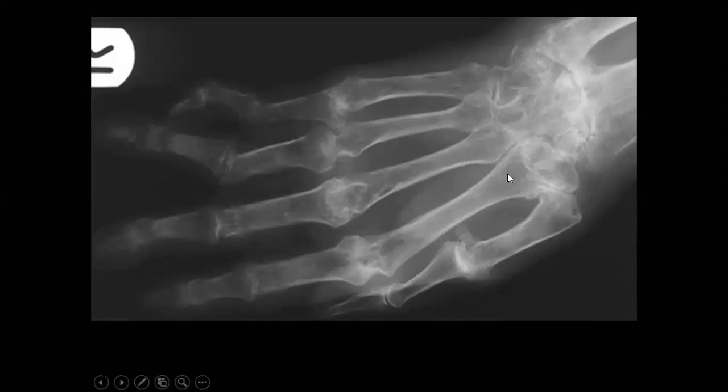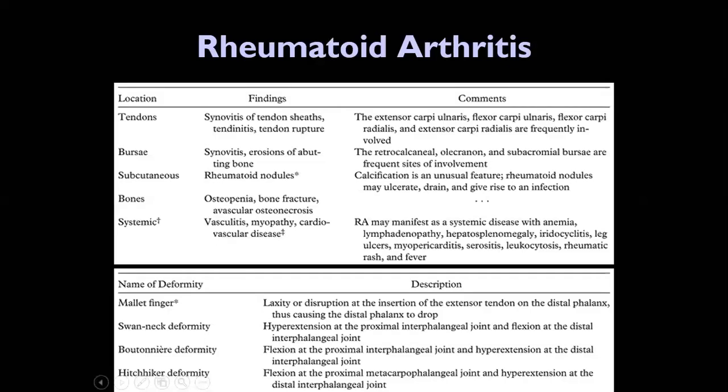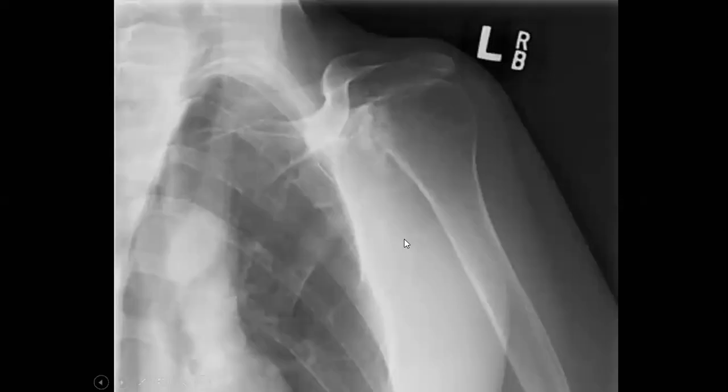So the advanced rheumatoid will be one of the best differentials. Then you will check all the deformities and the appearance of rheumatoid arthritis. You will read about it in the text more and more. Okay, let's go further with this case and try to make a good differential, or at least describe how it looks here.